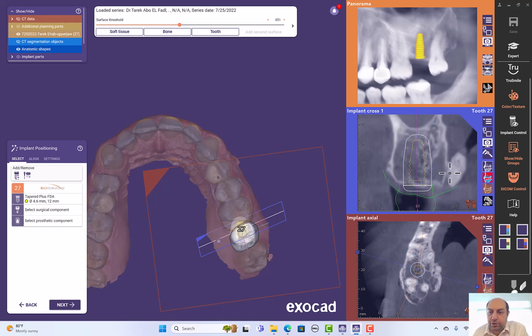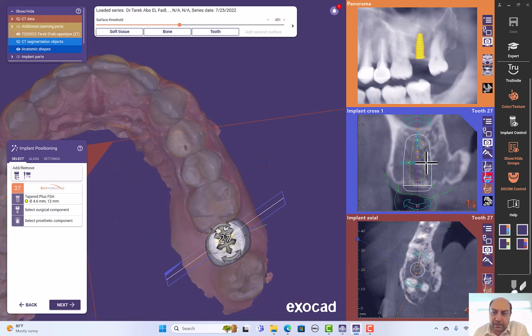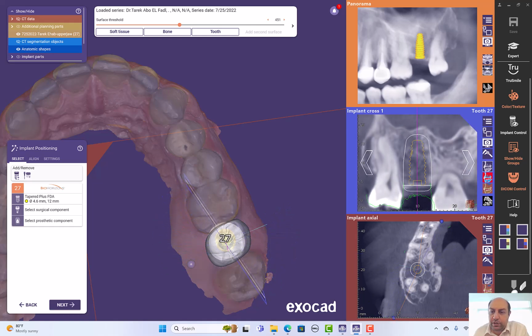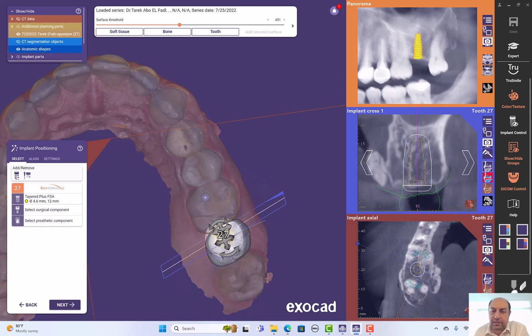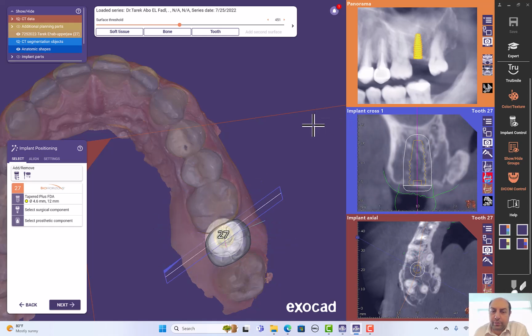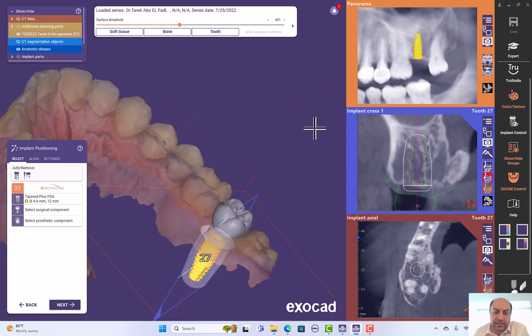And if you move through the cut here, look at this cut, you can go to a 360 motion, so you can adjust the implant in any place, in any position. As you can see here, I am moving 360 degrees all around to make sure everything is okay. My prosthesis is in the center.